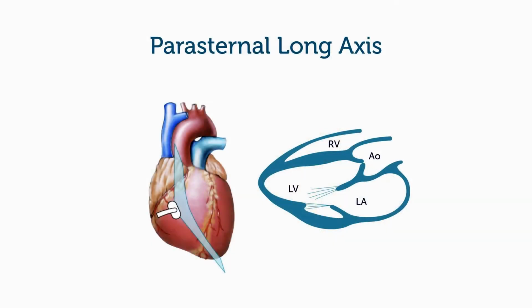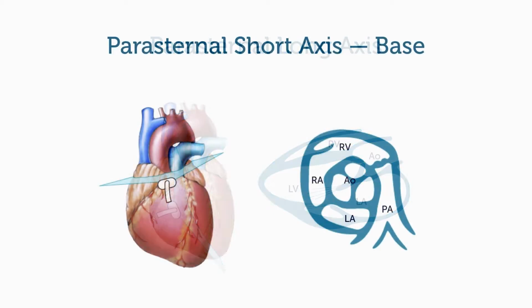Yes, when we were talking about aortic valve stenosis, we were imaging the heart from a parasternal long axis view, which cuts the heart, now you know very well, somewhere here through the aortic valve. And we used also the parasternal short axis view at the base, where the aortic valve is always in the middle of our view. But now we want to see if you are ready to make your own diagnosis. So I propose we go through a test.